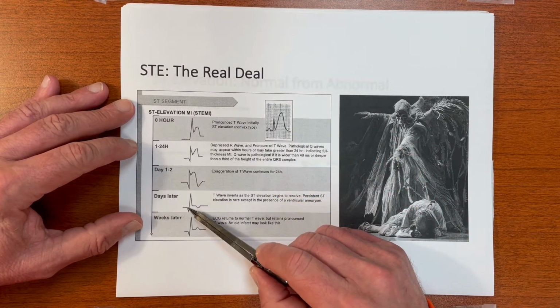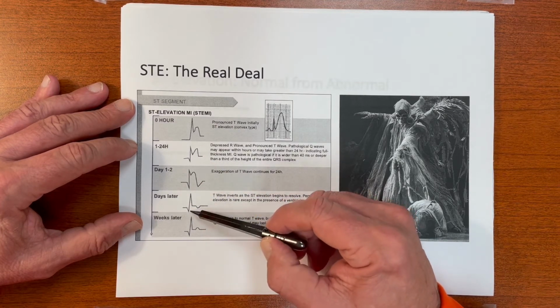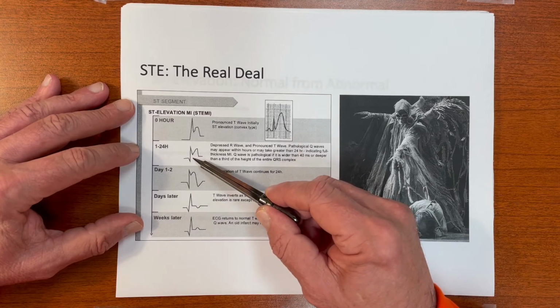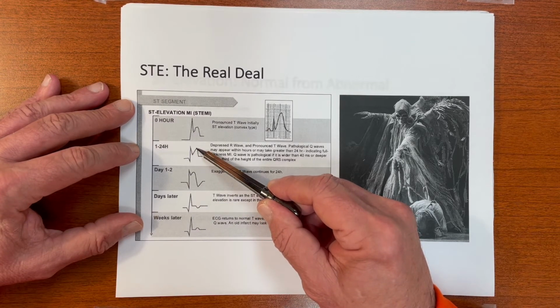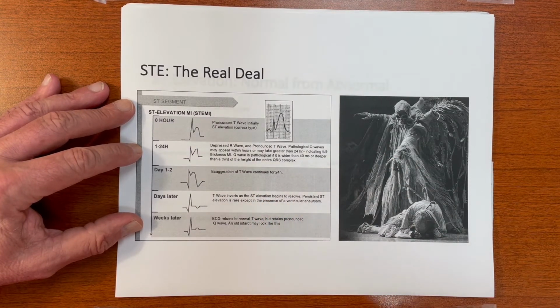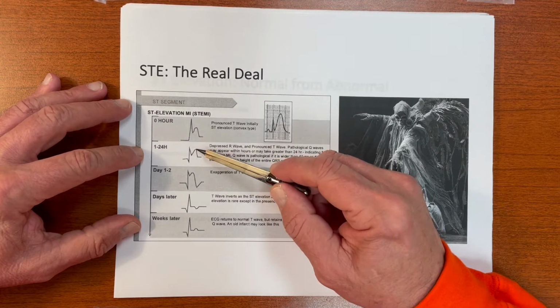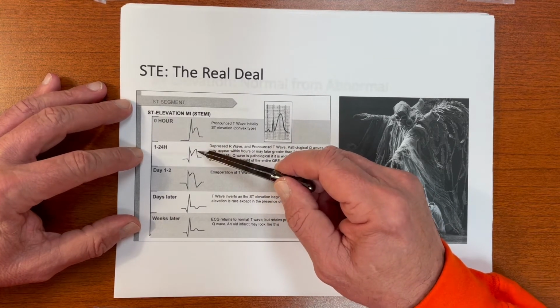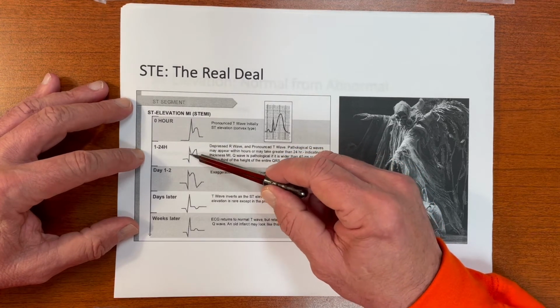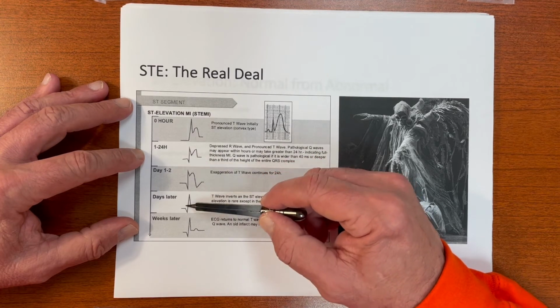The Q wave remains. The Q wave here is different than the Q wave here. The Q wave after days implies completed infarction, but hyperacutely in the setting of STs up in the correct history, it just implies the fact that the acute ischemia has rendered the myocardium electrically silent, and it can't conduct, it doesn't get an initial vector, okay? And it gives a Q wave.